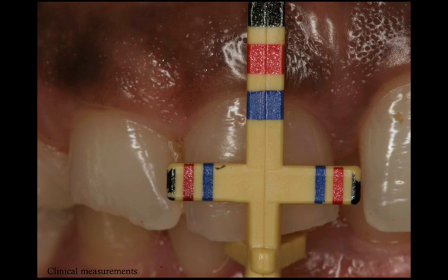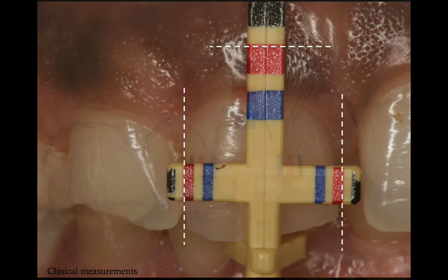So how does this proportion gauge work? It looks like a cross. It has some lines in 3 colors, blue, red, and black, and also lines in between. If you have a tooth that extends, let's say, to the outer border of the red line, it should be as long as the top border of the red line, and that would give you the proper tooth proportion. So it gives you an idea how much tissue to resect.